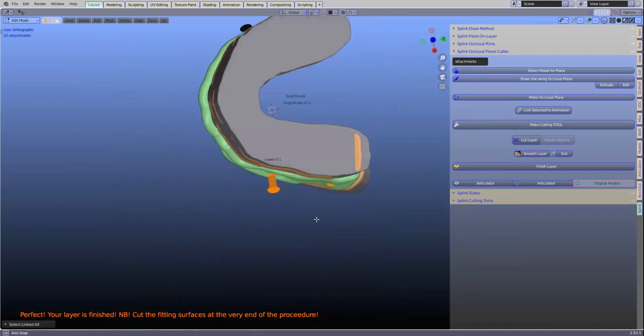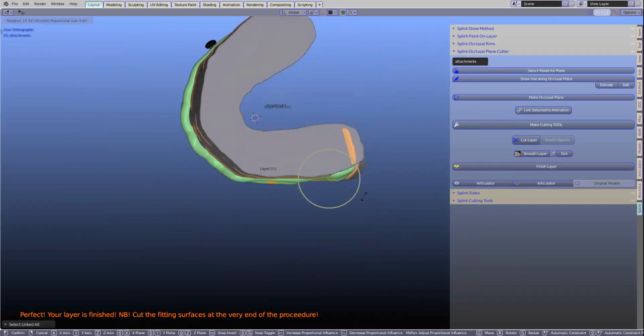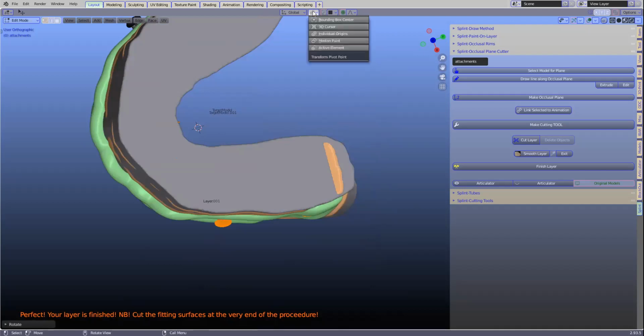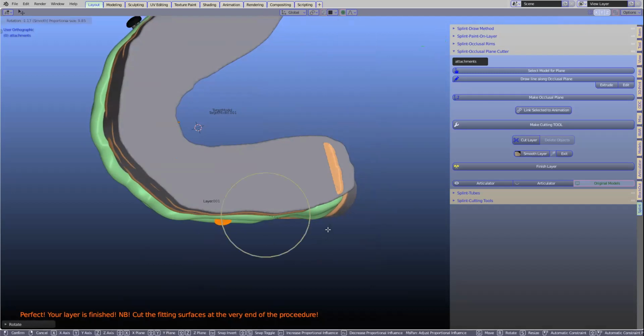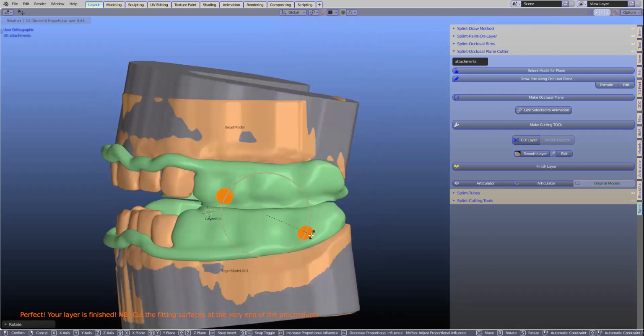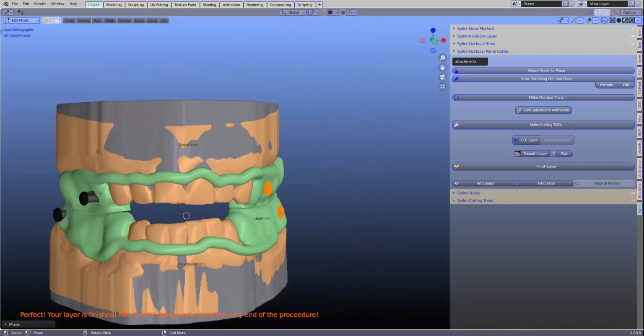Look at it from the perpendicular side, R to rotate, G to grab. And I'm going to be placing these where I want them to be. Like that. Okay, this is up to you. If you don't want to rotate it along that axis, you can always change this up top here to active element. No, I think median point. You see, then it rotates in the middle of those two, which will probably make it easier to rotate. Now, get them more or less the way you want them to be, and then individualize.